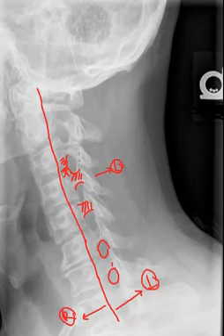If we look more posterior, you'll notice this very nice lucency here at multiple levels. This is actually the facet joint with the intervening articular pillars. This structure comprises the posterior aspect of the IVF, or the intervertebral foramen. So when we think about the borders and what could potentially cause intervertebral foraminal stenosis or narrowing, we have to consider uncovertebral joint arthrosis, intervertebral disc herniations, as well as facet joint arthrosis.